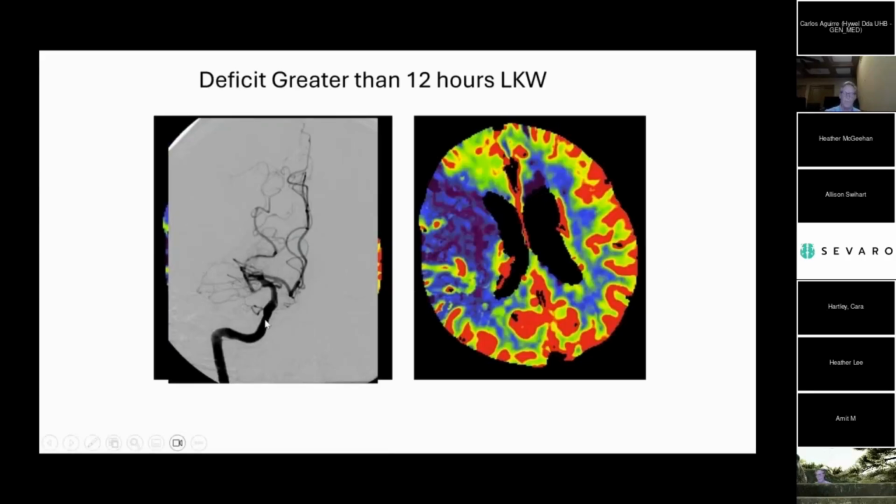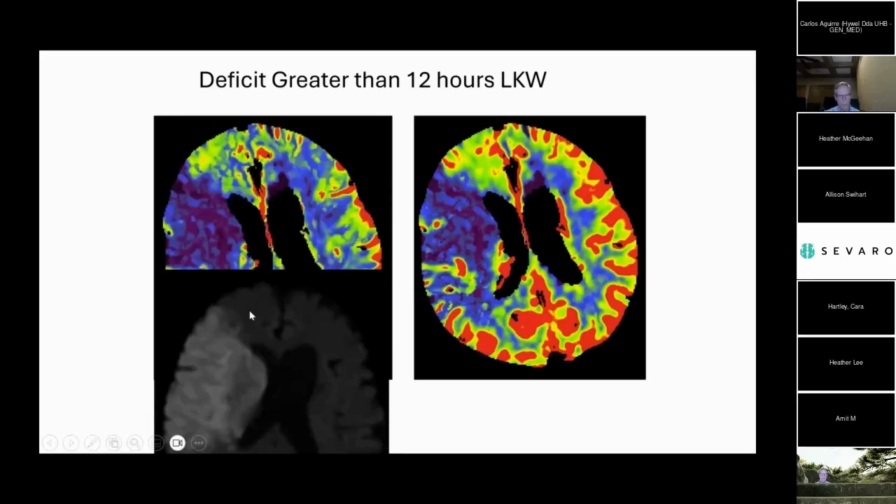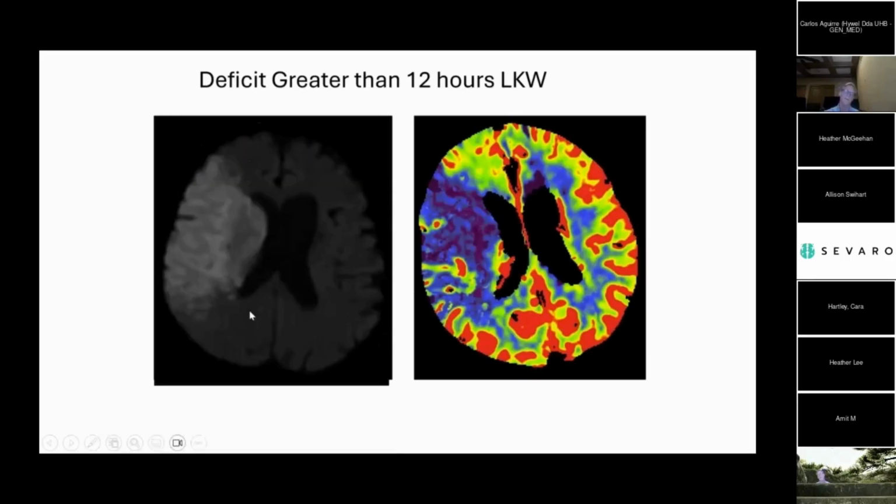And so I helped a friend as well. But anyway, here's the ICA. Here's the ACA, and the middle cerebral artery is completely out. So I worked like a dog with a penumbra. I got it open, actually. But despite getting it open, I didn't really help the patient.